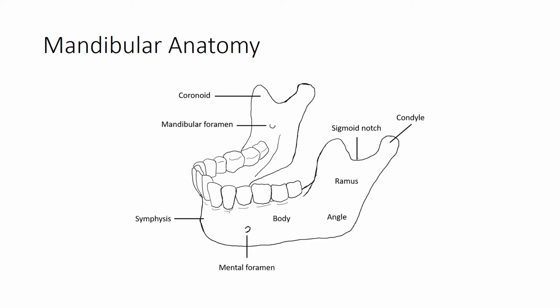What is more common is a fracture that people incorrectly call a ramus fracture, and that's this. This is a subcondylar fracture. It extends from the sigmoid notch to the posterior border of the mandible. It's in the subcondylar region, which is really right around here, all this region.